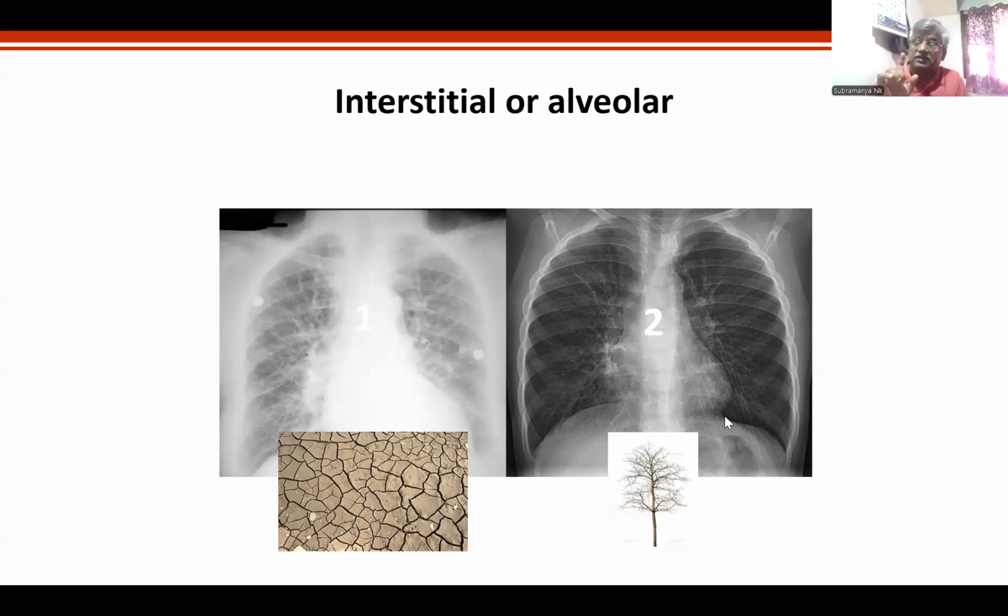In an X-ray, please understand this. This is very, very important for you. Very important because this is where you pick up the hypoxia and the reason for hypoxia. Okay, I'll go further.